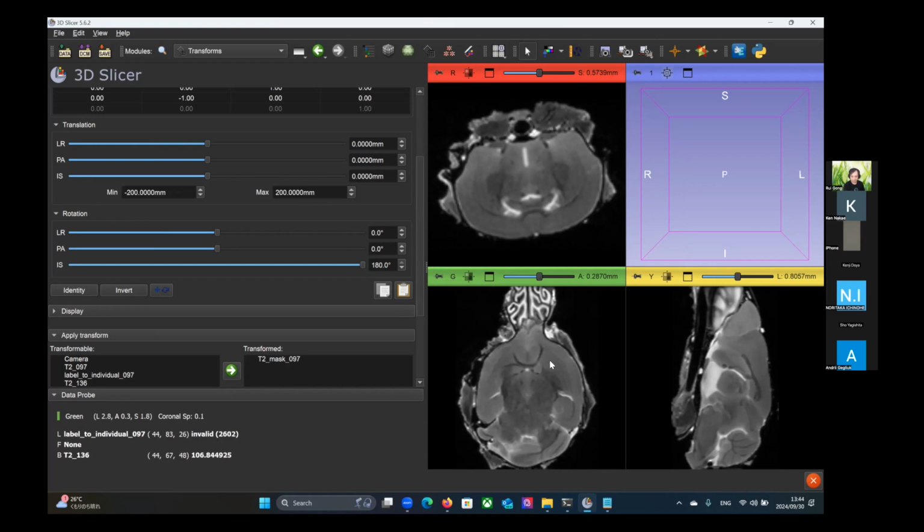By the way, I'm sorry, this might be too specific, but do you know why this plane looks upside down? Because we properly set the parameter. I have no idea. Every single image from the Bruker machine, our images look like this all the time. Okay, so this is correct. Even if you may think something is wrong, we set the coordinates parameter properly.